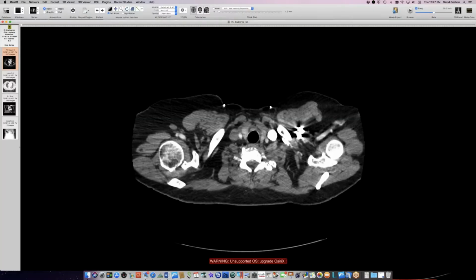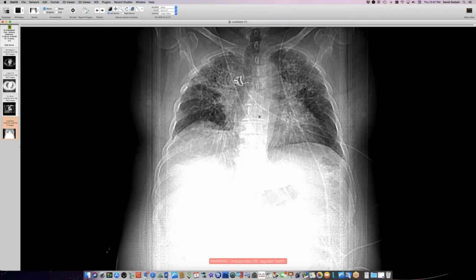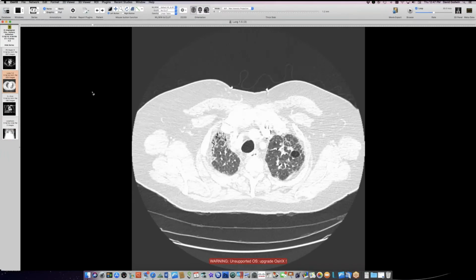Okay, and then this fellow has an interesting work history. I don't have a chest radiograph on him, but he's got several. These are all outside CT scans. So lowish lung volume here. He is obese, that's part of it, but he also has a lot of lung disease. This is chronic lung disease. It's been there for years. And this is what it looks like on cross section.